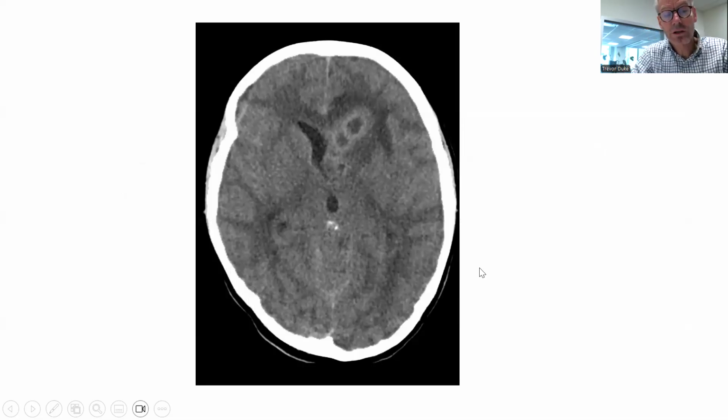This is an example of a cerebral abscess, and as I said, this was a 10-year-old boy who presented with headaches and facial pain. He had very severe forehead and cheek pain. And this is a cerebral abscess related to severe sinusitis. Cerebral abscesses commonly occur in the frontal lobes, and the way you can tell it's likely to be an abscess, it's ring enhancing. All right, it looks encapsulated.